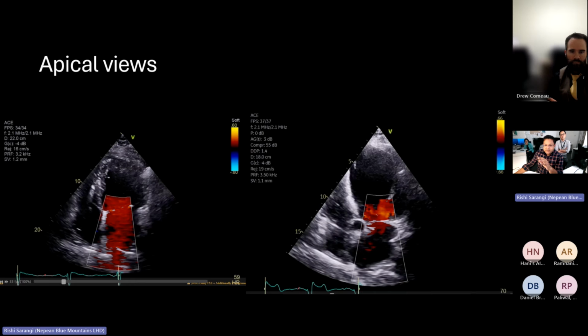Now, how do I know it? Because of concomitant fluoroscopy studies seen along with echocardiography, showing that in the apical 5-chamber view, it is the right upper pulmonary vein which is mostly seen.